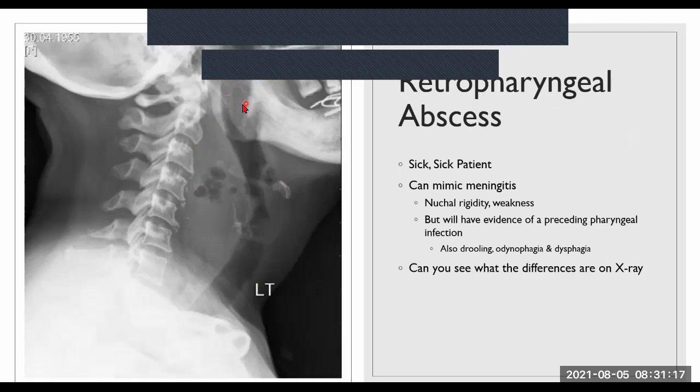All right. So here we have our pharynx. Here we have our epiglottis over there. And then we get into our trachea and our esophagus over here. So you can see the trachea is not involved. What do we see that looks strange, however? There are some things that look odd over there.